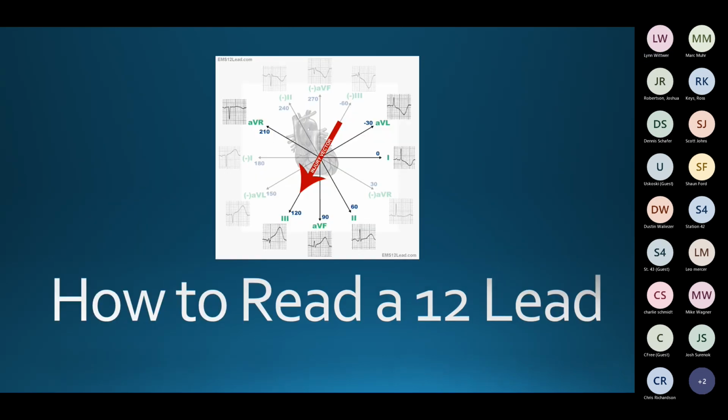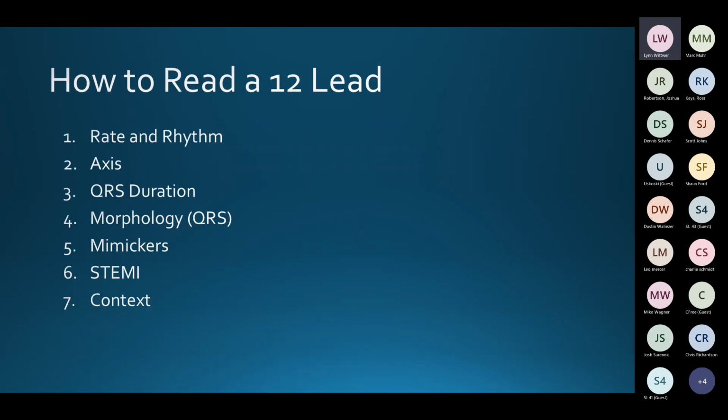So, how to read an EKG. This is going to be basically, it's not even EKG 101. I'm assuming everybody here knows how to read an EKG, but we need to practice reading EKGs, or ECGs, much more, and specifically a 12 lead. So this is the basic format of reading an electrocardiogram.